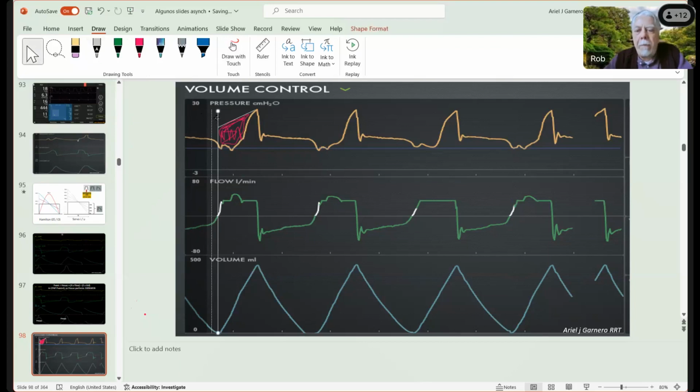Well, I'm going to have to agree, because strictly speaking, those little inspiratory bumps in the flow waveform are basically showing you PMUS, right? So when the flow goes up, PMUS is active. When it goes back down, the patient is relaxing, but the ventilator continues with inspiration.